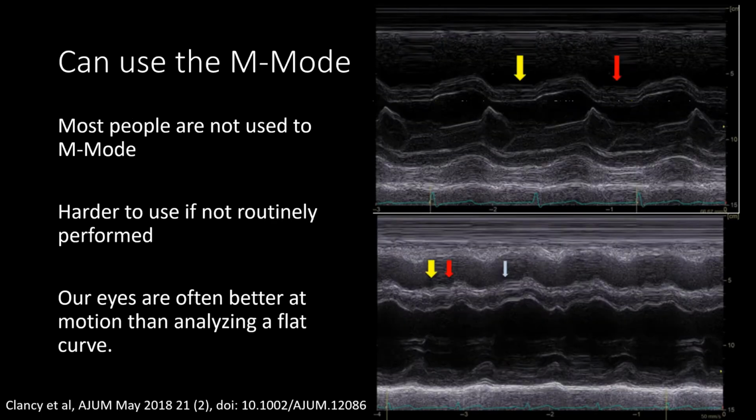People advocate the use of M mode, and one of the difficulties with the article listed above is that it relies a lot on M mode. This is a very helpful mode if you're experienced with it. For most users, however, the subtle changes will be hard to be confident about. Our eyes are usually better acquainted to 2D images and motion due to simple exposure to seeing cases.